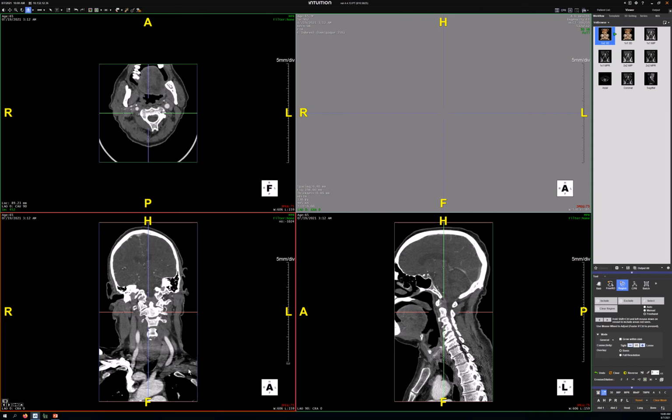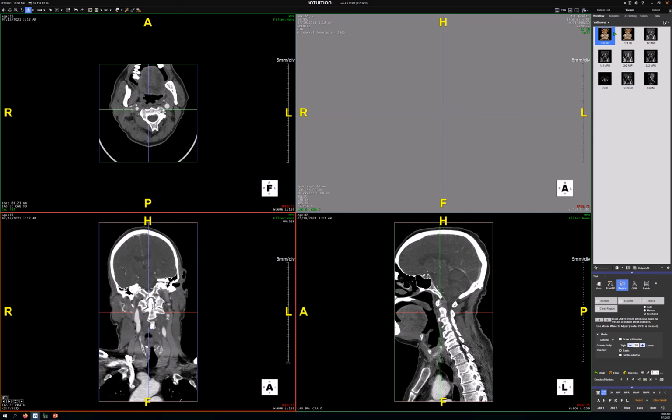Now we're going to focus on the pathway of the carotids through the skull base. We'll do those first. Keep going until you see the carotid siphon. Okay, there it is going through the petrous temporal. We could start there. Is that good?